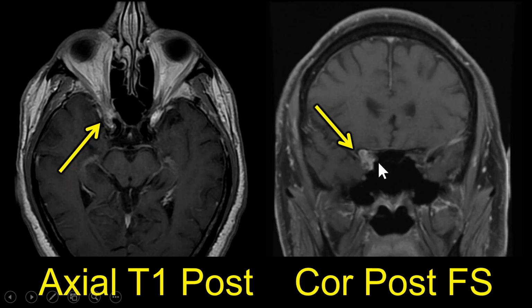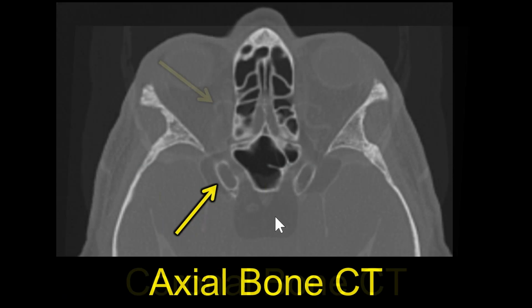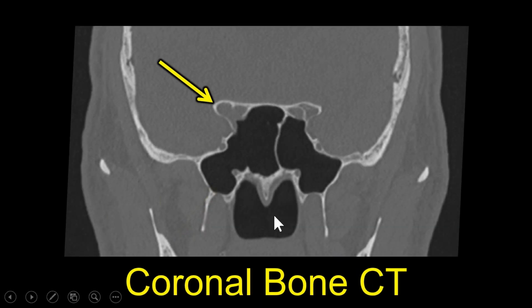So that makes a huge difference to this patient if they had recognized that preoperatively. The CT, again, we're looking at densities. That can be a little confusing, but we have very important anatomy right here. This is a coronal CT.